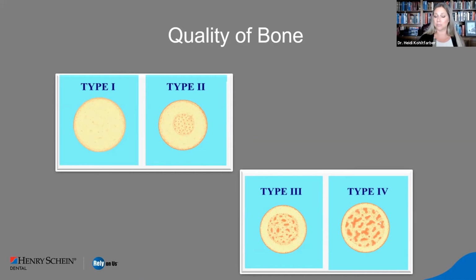You can play with that, see what you find. Air should be minus 1,000 if you have true Hounsfield units. You'll notice if you're playing in the air with a CBCT, many times it's a positive number. So it doesn't work the same as it does with medical CT, but we can still visualize things very well.